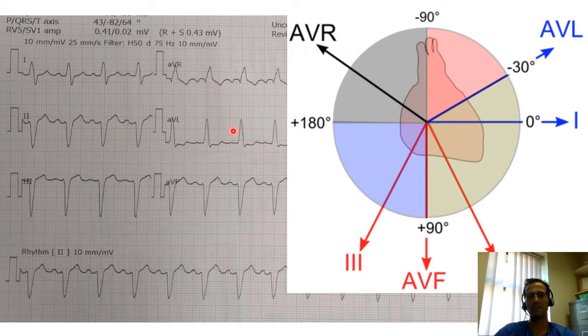And here you can see that the signal is between aVR and aVL, and so the signal is pointing somewhere around here at slightly under minus 90 degrees. So that's a very, very profoundly negative QRS axis. And in fact, if it's negative in 2 and 3, or predominantly negative in 2, that shows that it's swung round past aVL and is negative. If, on the other hand, it's negative in lead 1, that's because the axis has swung round and is pointing predominantly away from lead 1. And that would be right axis deviation.